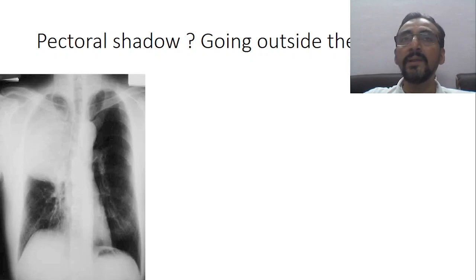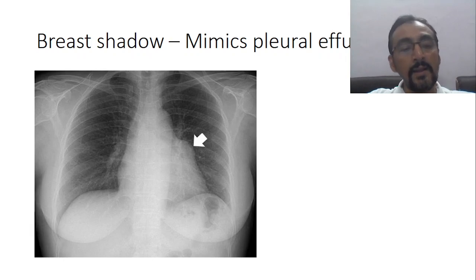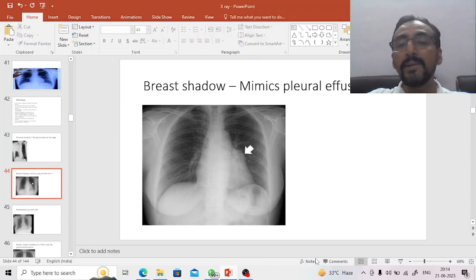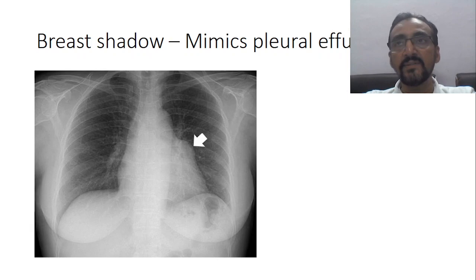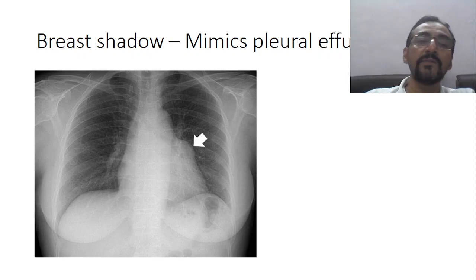There is no problem in the patient, but even then, because of this type of problem, you can get confused, and sometimes you can land up in a wrong diagnosis. Now another important thing which is present is breast shadow. Okay, especially this problem will be there in females, and even sometimes breast shadow may also be seen in fatty males. So breast shadow may confuse with many things.